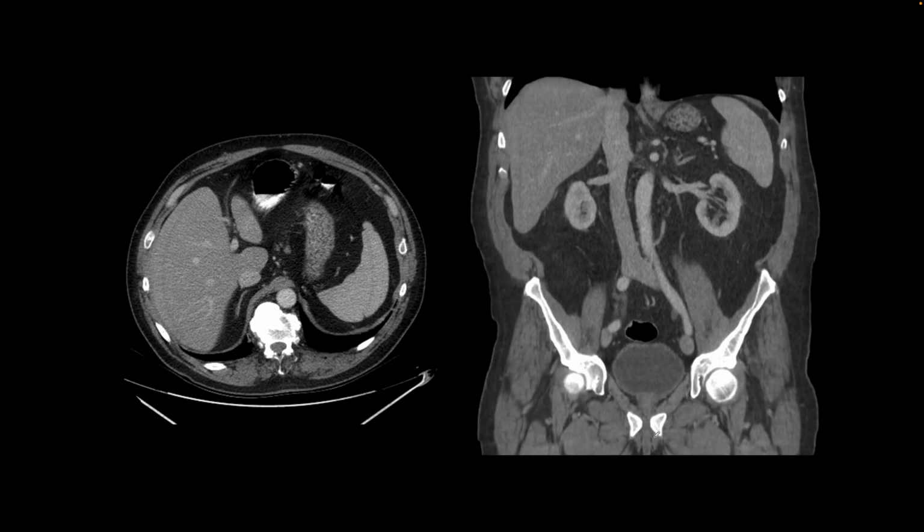This is our next patient, and here we have performed a CT abdomen and pelvis, and we see this artifact. I'm going to draw a line adjacent to this ring artifact. Ring artifact is frequently seen on CT images when the patients are large or pretty close to the gantry, or when one of the detectors is not working. So it's a ring-shaped hypodensity on the images.